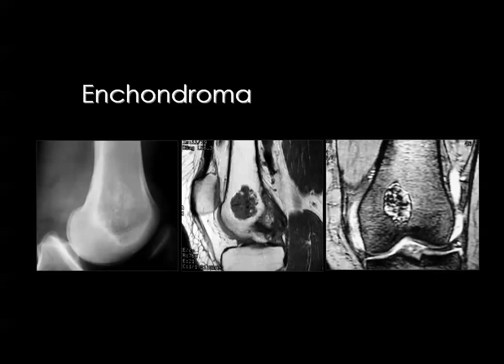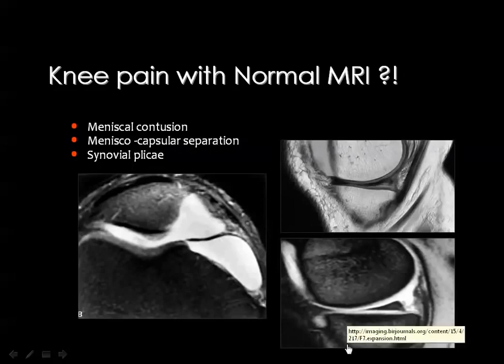I want to say that this lesion is an incidental finding in many cases and is not responsible for the patient's complaint. Then you may mention this lesion and say this is an enchondroma, which is an incidental finding, and look for the rest of the knee. Evaluate the meniscus, evaluate the cruciate, look at the collateral ligaments, look at the patellar retinaculum, look at any of the lesions I have mentioned, but do not concentrate on this lesion and do not recommend the lesion to be biopsied.